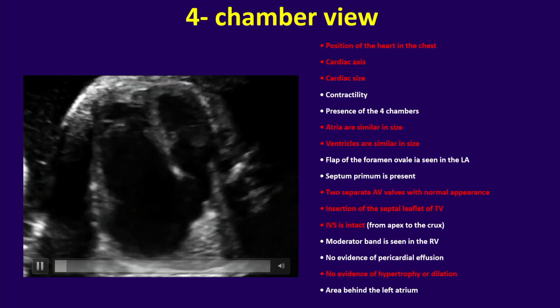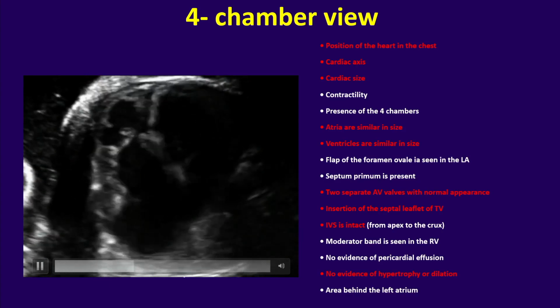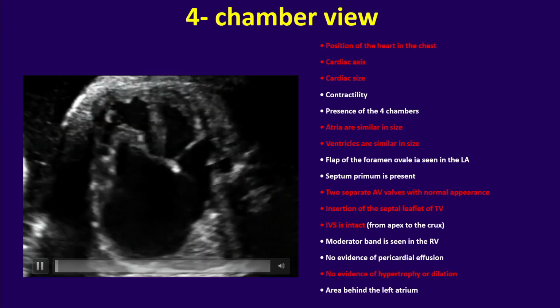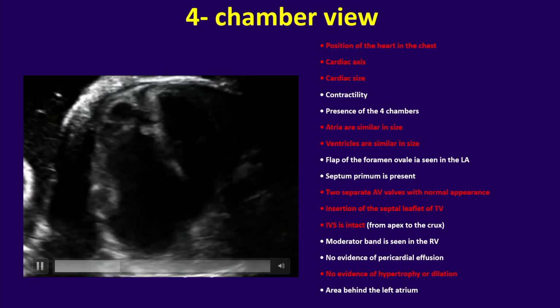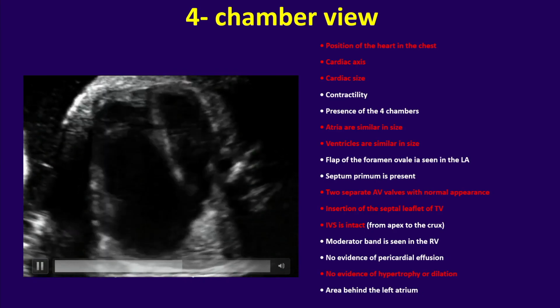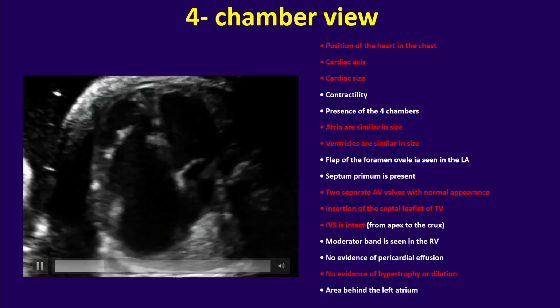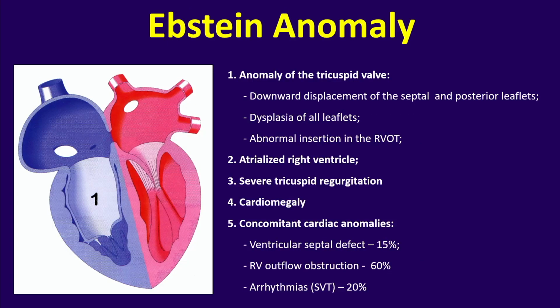So if you perform screening and don't really have time to look into details, this is the time to raise the red flag and send this patient for detailed assessment with fetal echocardiography. But this is just an example of how you can work through the checklist and utilize it to describe the changes in the four-chamber view. So in our diagnosis, I think that you all got that.